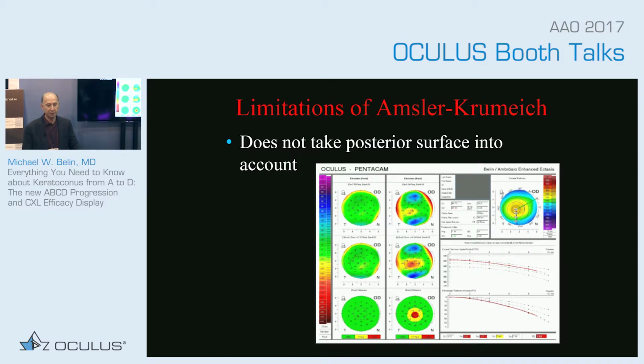It's not suspect or these other terms I don't like. It's true disease. But the anterior surface, which is a late finding in keratoconus, is still fairly normal. So the patient has good vision. They have a prominent posterior ectasia, an abnormal pachymetric progression, and I'm trying to read the number from here. I think it's about 4 standard deviations outside the norm. But in Amsler-Krumeich, this doesn't even register.